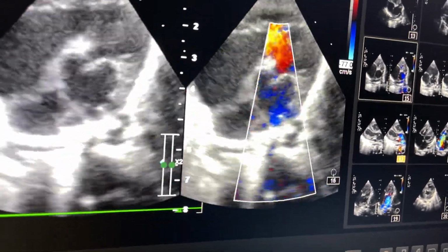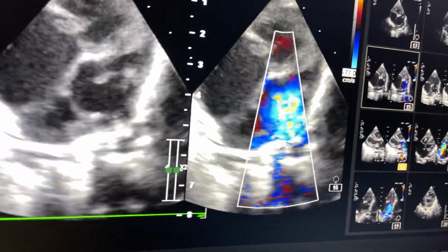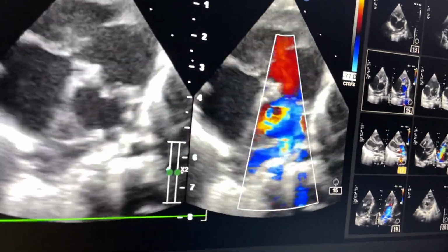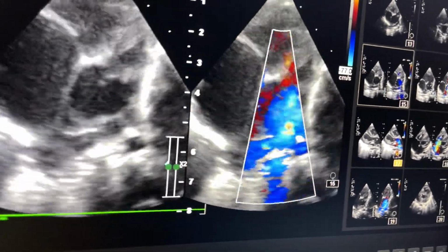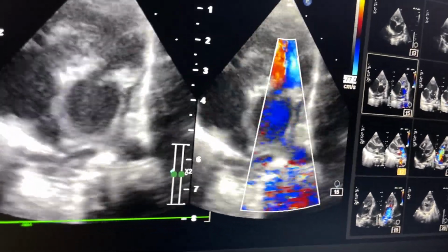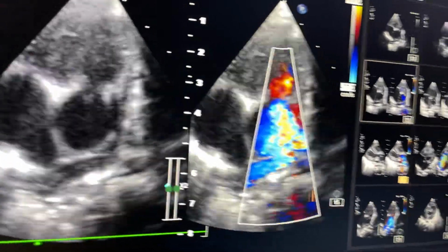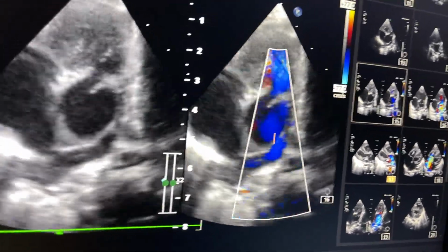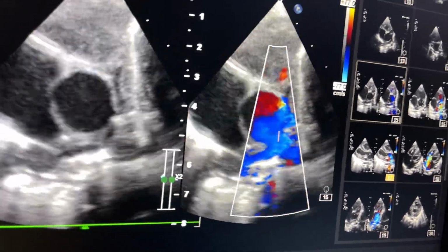Obviously, in this image, the branches, that is left pulmonary artery and right pulmonary artery, are coming from the posterior and inferior part of Truncus arteriosus. Because aorta is always anterior, truncus is always anterior, so the branch has to come from the posterior part. In this image, this is the most anterior part and this is the most posterior part. So the right pulmonary artery and left pulmonary artery are coming from the posterior and inferior part of truncus, obviously the under surface of truncus, you can say.